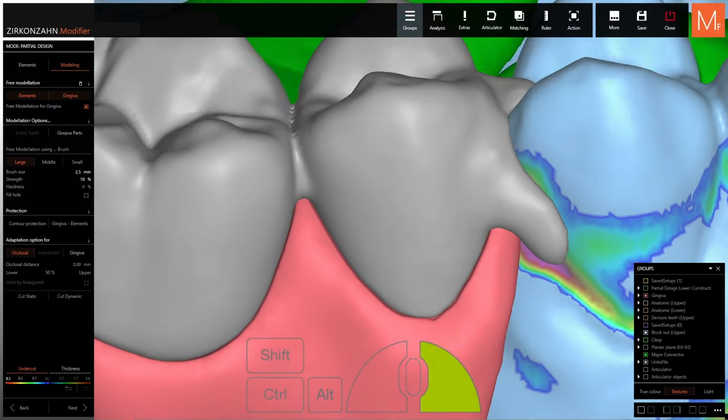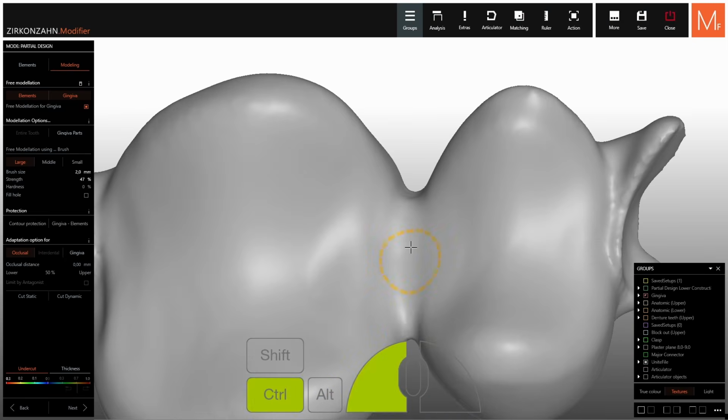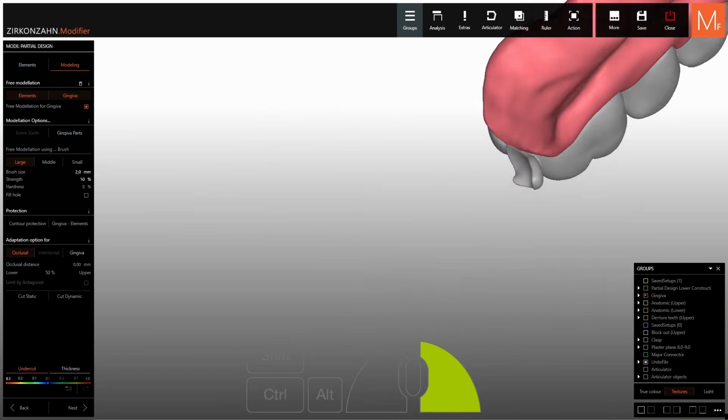We also fill up the interdental areas so everything becomes millable, making sure your smallest burr can enter these interdental spaces.